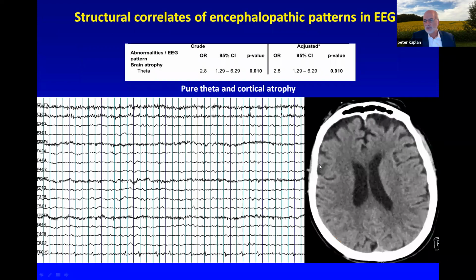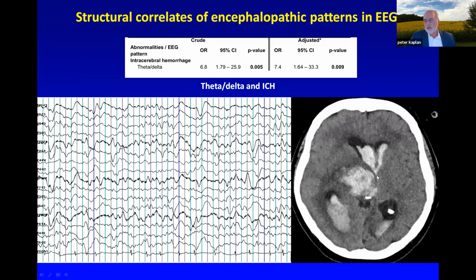Here you see the cortical atrophy, whereas the subcortical areas are relatively spared. And as you can see, the alpha is a little bit lower voltage and is slow. This is not the normal 8 to 10 hertz alpha. If you look at this intracranial hemorrhage, where again there's pressure being exerted outwards, but the cortex is spared, between these eye blinks you have cortical activity, but there are sudden episodes of slowing because of the raised intracranial pressure.